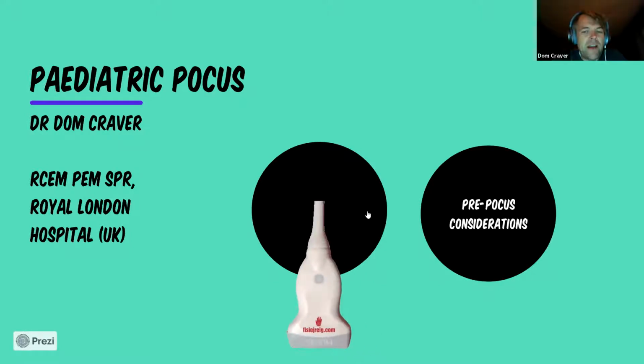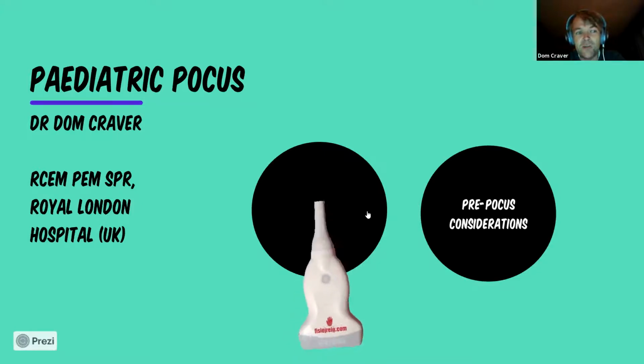So I'm going to give a very rough overview of some paediatric point of care ultrasounds, and I'm going to do it by just going through some cases. We've had a few sessions so far, so I'm not going to go into too much detail always about how to get certain images. I really want to show you some ways in which we can use it, but this is by no means exhaustive, and I'm not an expert.